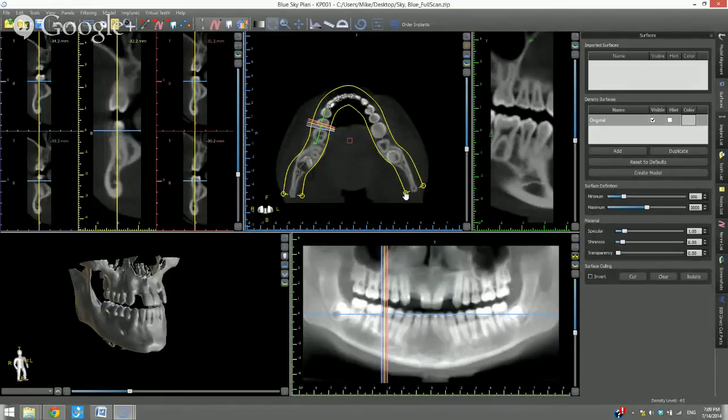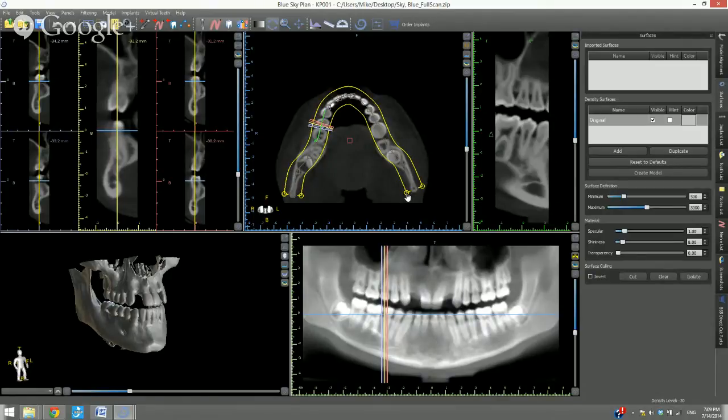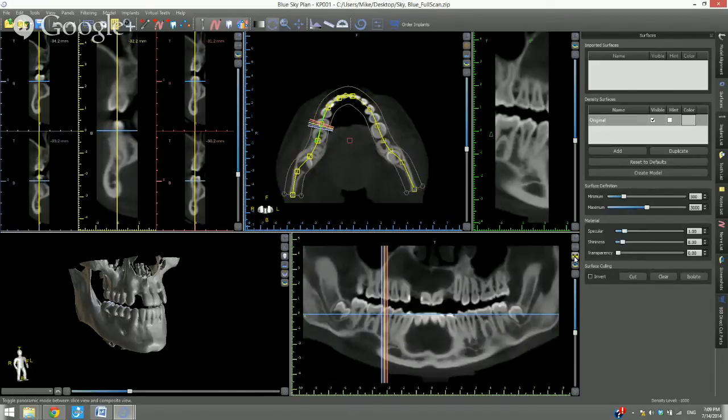We could once again change the thickness of that range just by grabbing the circles and moving them in the desired direction. We can also see how it affects our tangential view. It affects the thickness, the width of our tangential view as well. We could again press the composite panoramic button, and that turns off the composite functionality. And now we're back to our individual slice mode.